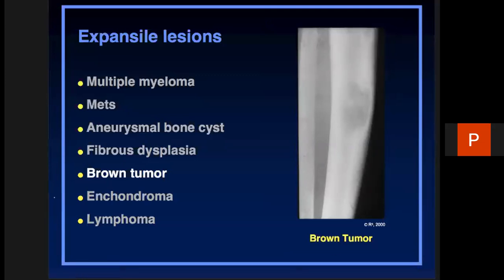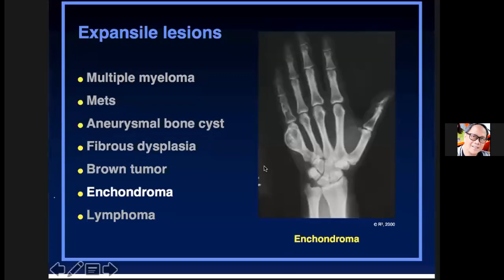Okay. So how about this one? This is an enchondroma, and where is the enchondroma found? That is the enchondroma here. Where is it located? Metacarpal. In which metacarpal? Fifth. Fifth, very good. Okay, so this is one, two, three, four, five. No? So there is expansion, but if you look at the cortex, it's still intact. No? So you're leaning more towards a benign type of lesion.